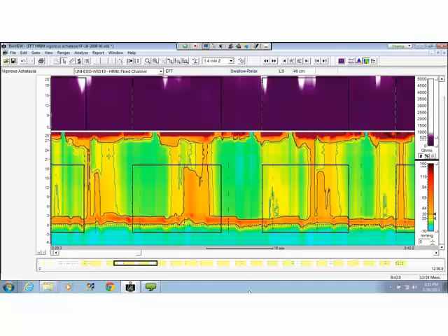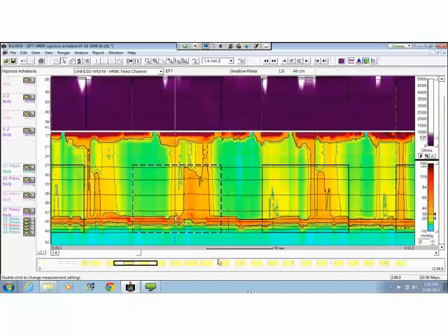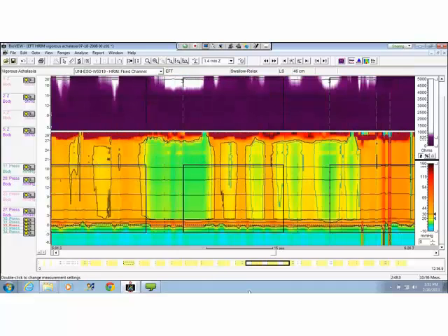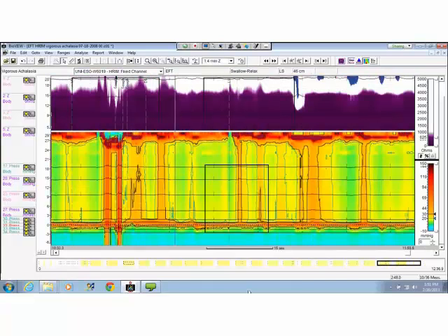So flipping back to waveform, you would follow along this line right here and measure that set of bumps right there. Okay, and that's only those? Yeah, only those. That's why I use this one as this is your vigorous achalasia sample. This one over here, that's why I use this one, because it had a nice propagation, primary propagation right off of the striated muscle. And I included just out to here, not any extra pressurization areas.